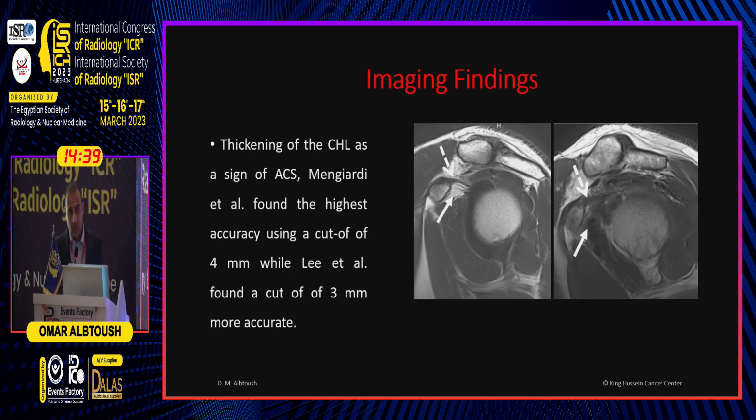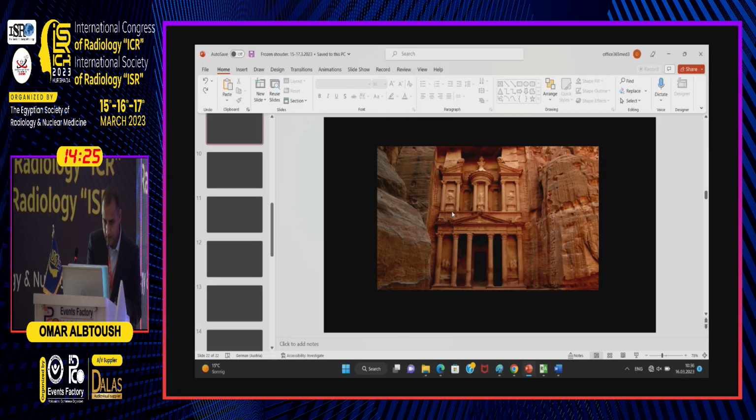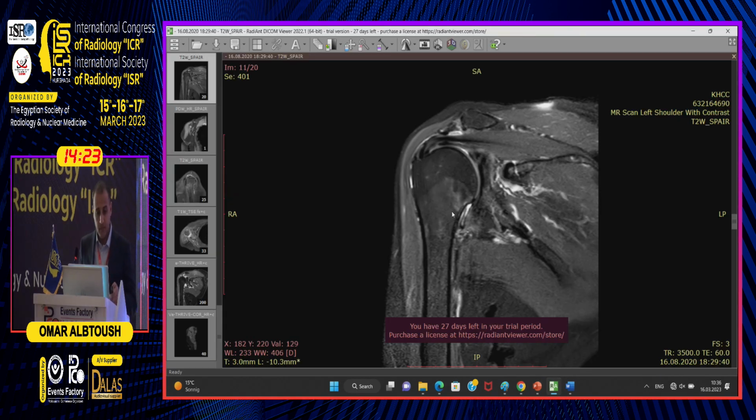Okay, now we move to the most interesting aspect. I will show you two cases. Please have a look here. This was a routine case in the institution where I'm working.